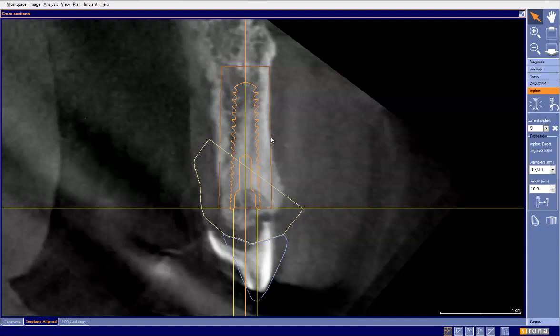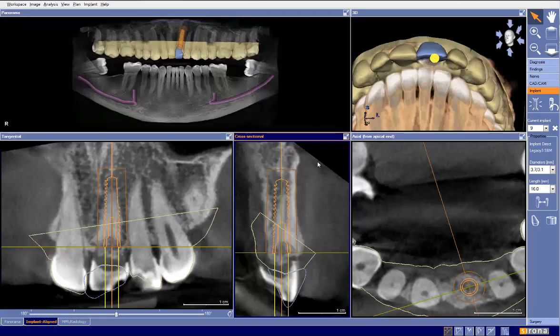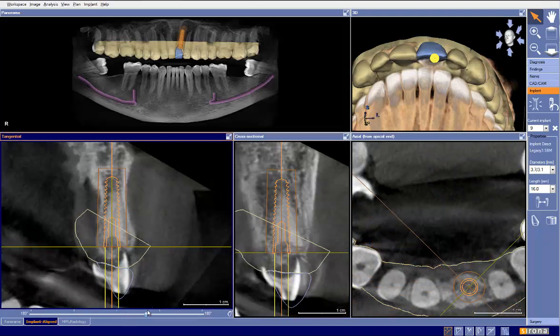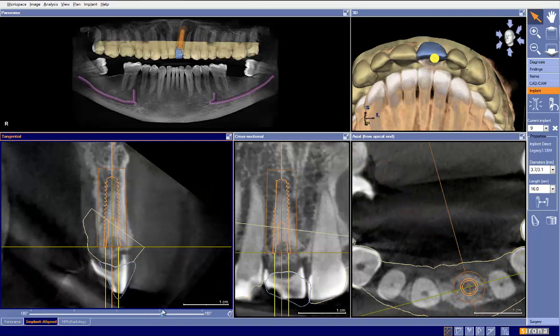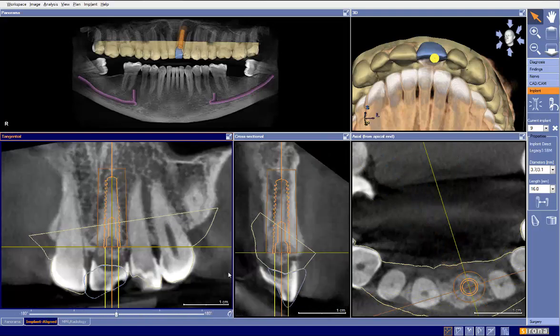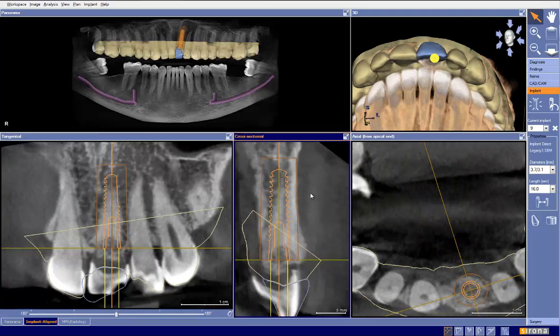Are we going to have this cortical plate here after we take the tooth out? Are we going to have to expand and rotate and kind of shimmy this root out, and then not have a buccal plate left, or maybe have a dehiscence in the buccal plate? Or maybe there's a dehiscence somewhere that we're not seeing here as we rotate through. And as we rotate through, it actually looks like our cortical plate is well intact here. But these are some of the things that I'm taking a look at in this particular case.